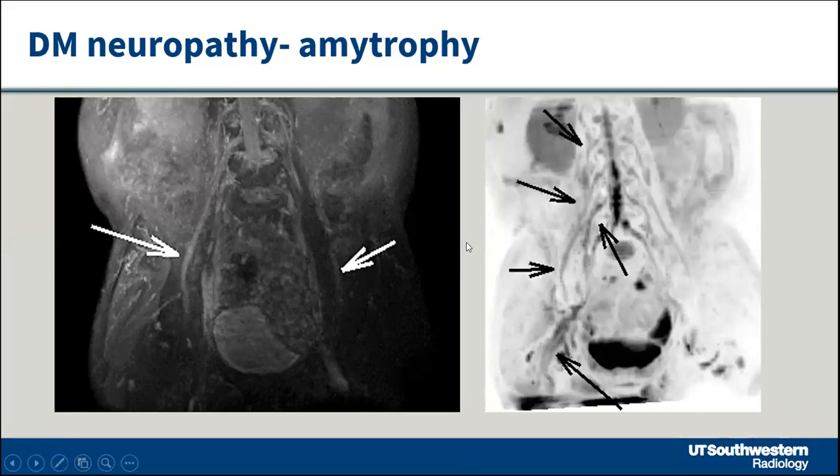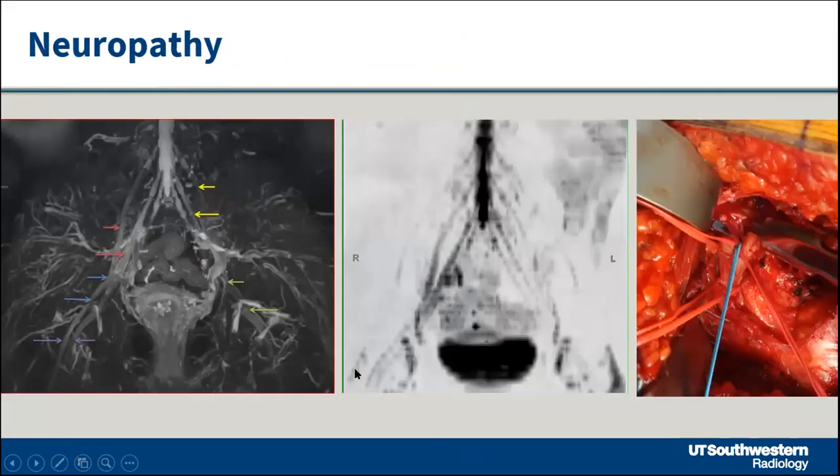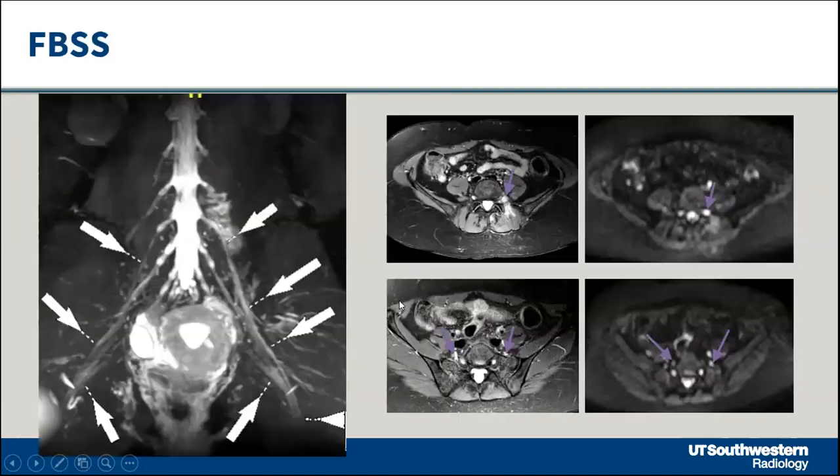And we often get referred these cases from EMG and neurologists where they are not sure if it's radiculopathy or amyotrophy. That's what you will see with that. The nerves become conspicuous. Or a piriformis syndrome, where you'll see this L5, S1 bright, split sciatic nerve, and bright peroneal more than tibial components. So you'll see that stuff again on ADC maps.